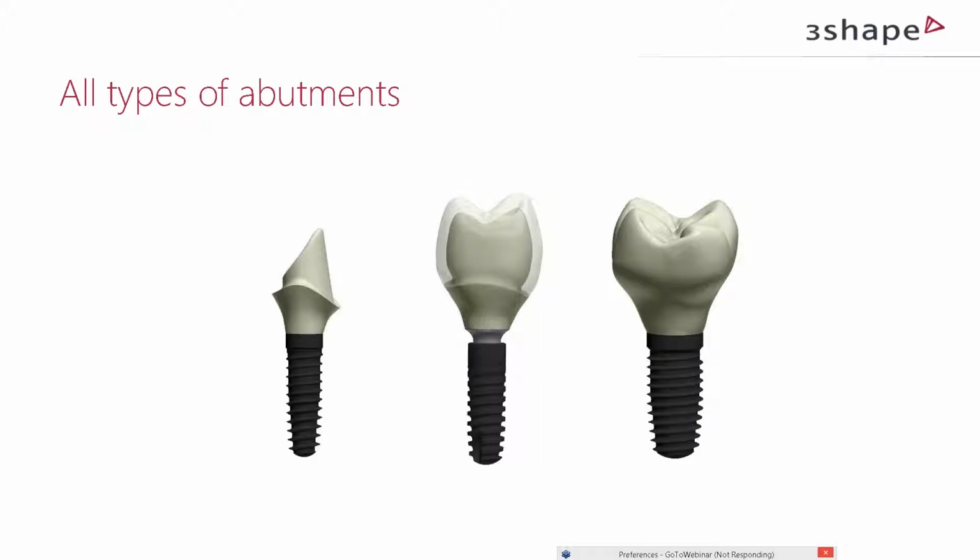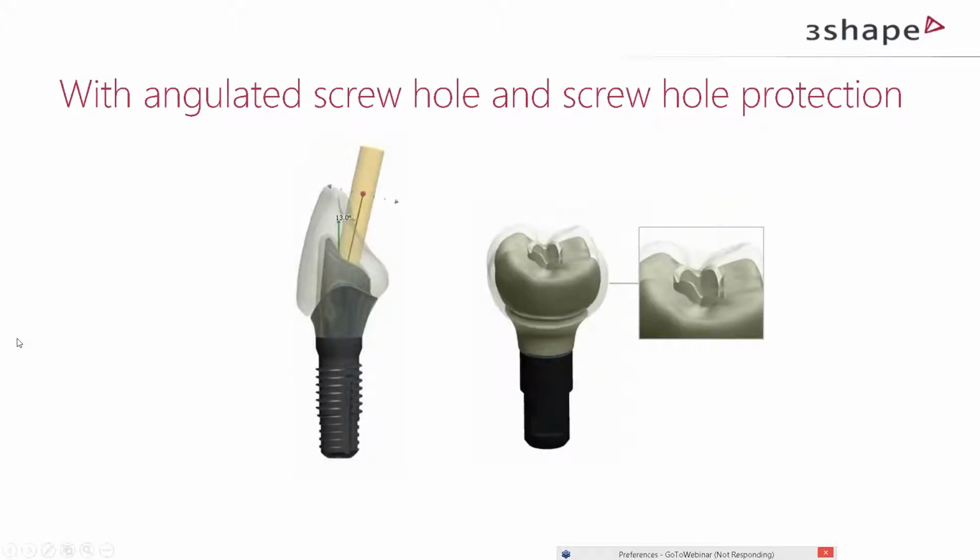Right now, modifying my order form just to design a customized abutment, we already have the design and the emergence profile information, so that should be really easy.